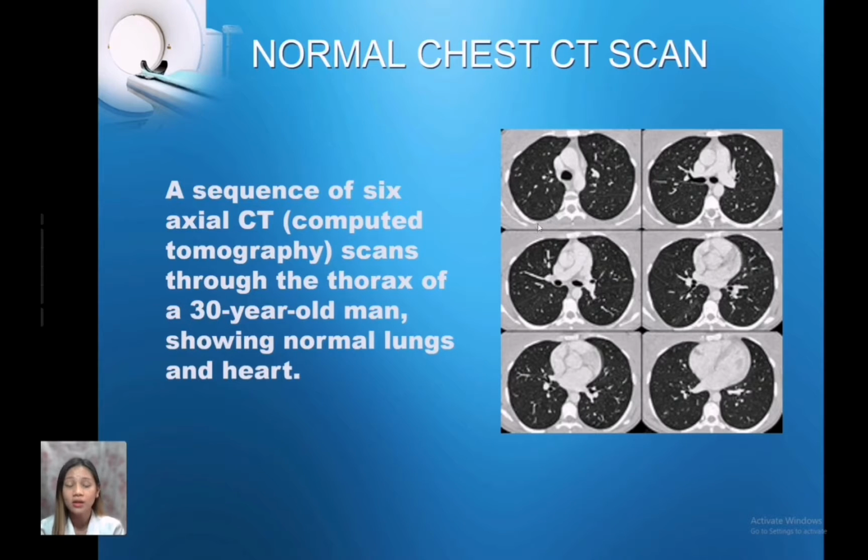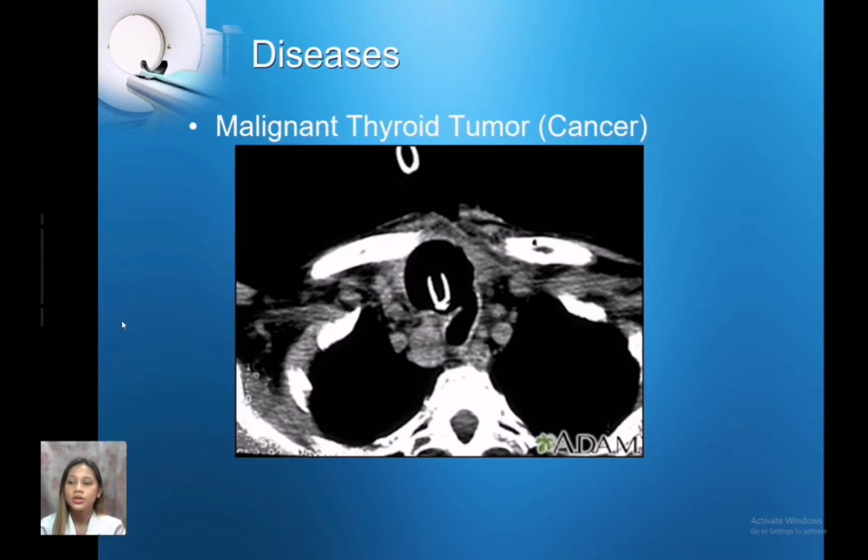If the lungs appear totally black, or there is no ground glass opacity or halo sign that you can see, it means our patient, or the CT scan result, is normal. So there is no condition or disease in our patient.